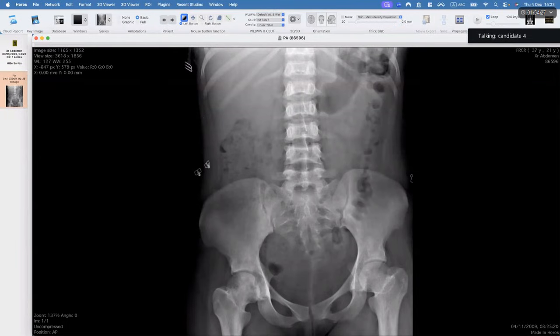So for the differentials on the findings of this patchy sclerosis of the right femoral head, I would like to know the history of the patient. If the patient is young and having right-sided hip pain, this can be an early stage of right femoral AVN, where I cannot appreciate significant osteoarthritis at the moment, but some patchy sclerosis and lucencies are there.